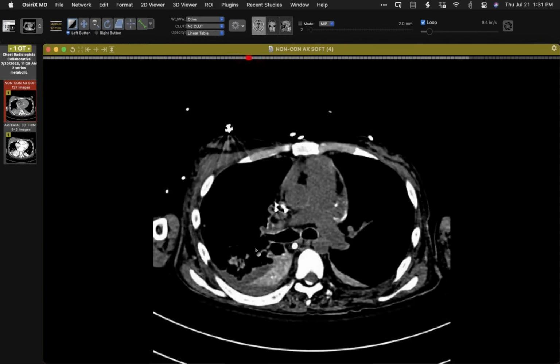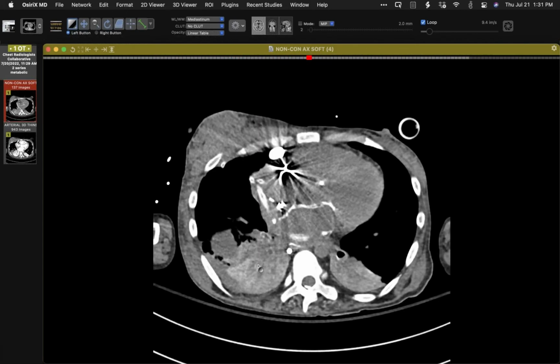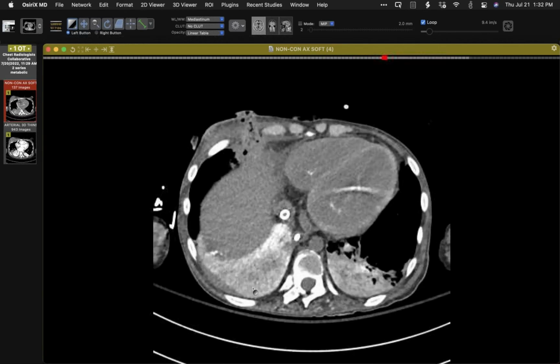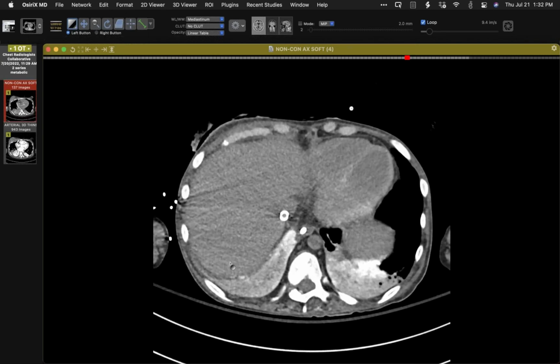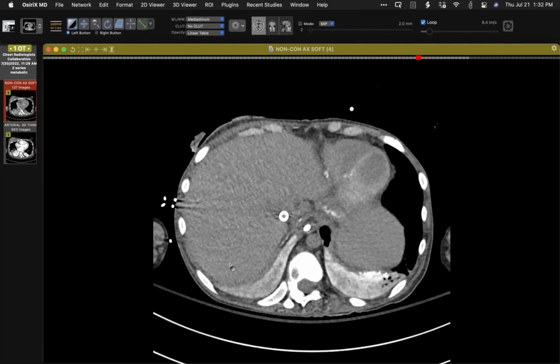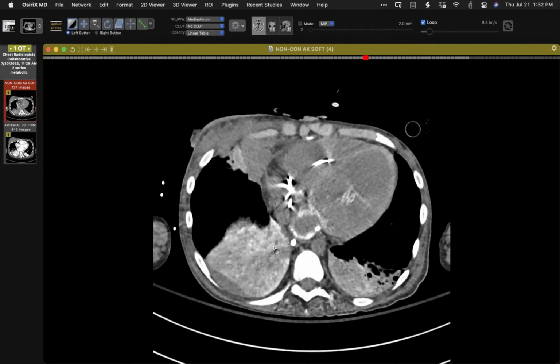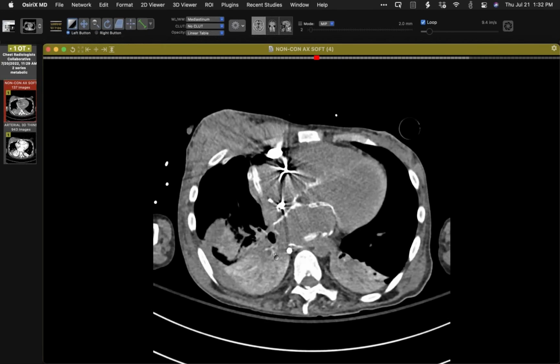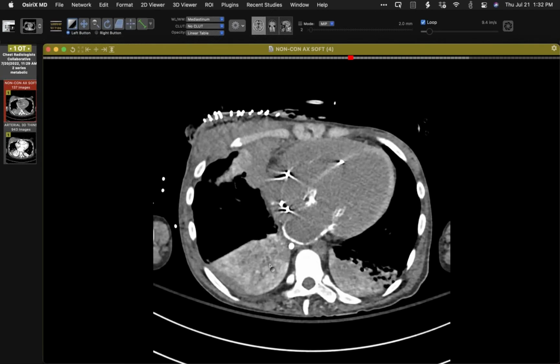So we have calcium in the lungs up here, and because the lung is atelectatic down here, they look like that. So this is a patient with chronic renal insufficiency from childhood. And this is so-called metastatic pulmonary as well as cardiac left atrial myocardial calcification from that pretty dramatic amount of calcium.